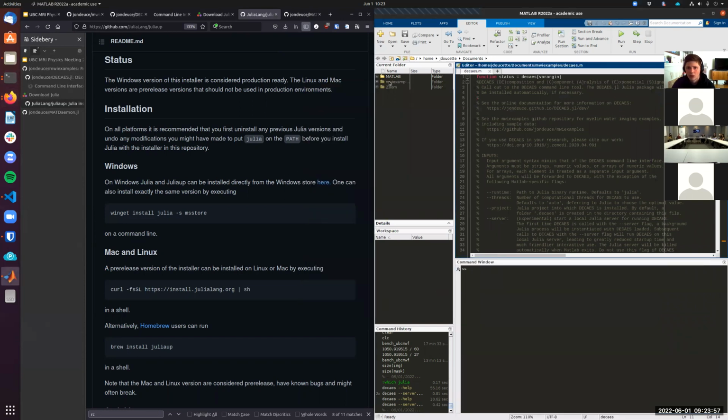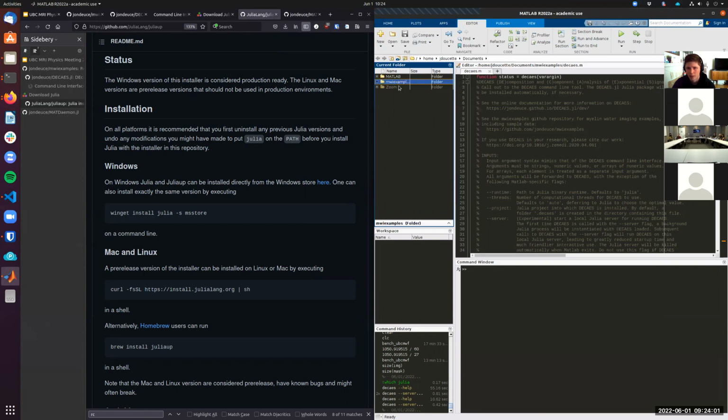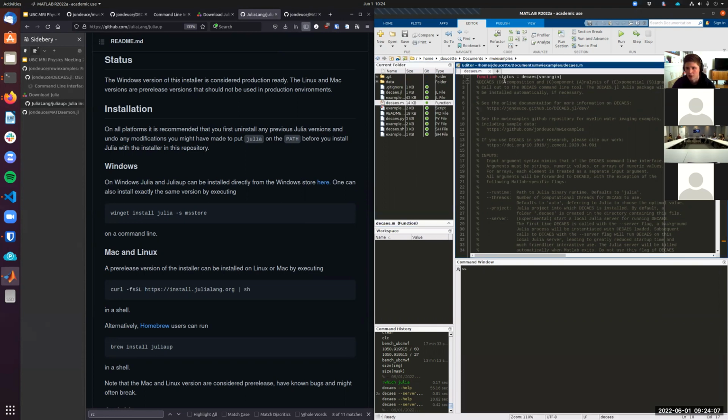So here I have the Myelin water examples folder. I'm going to add it to the MATLAB path and then go in here. Okay, so here we have the decaes.m file. So now we are ready to get started with using the MATLAB version.